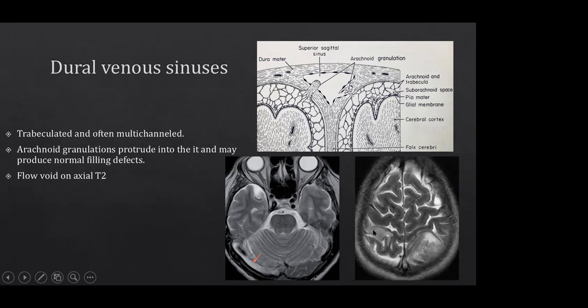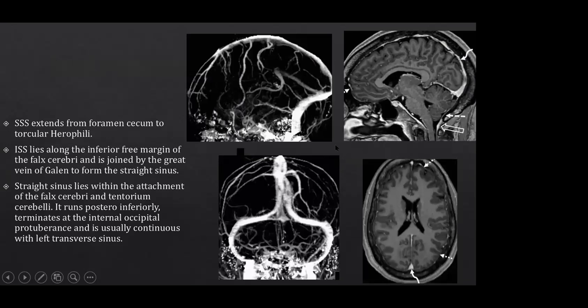someone with a thrombus also within the transverse sinus, giving rise to venous hypertension. So the sinuses, we have looked at the superior sagittal sinus. The superior sagittal sinus runs along the anterior-posterior length of the head, and it doesn't necessarily have to be a single channel, especially anteriorly.